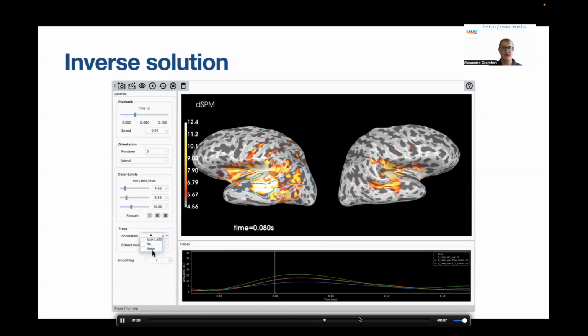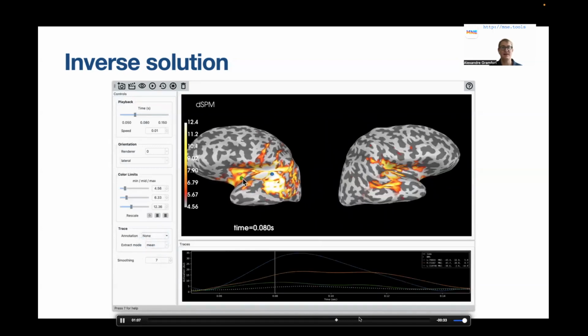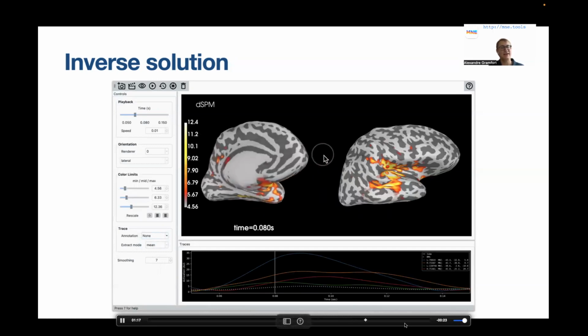Right, so here, removing the atlas, going back to pure vertex-based activations. Okay. So that gives you a glimpse of the UI for interacting with source estimates. I said the recent one that was probably added over the last 2 or 3 years.